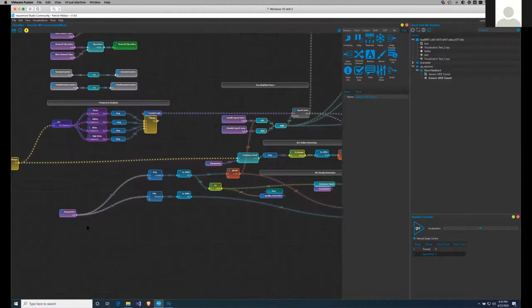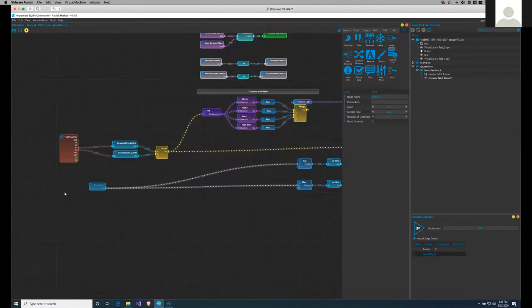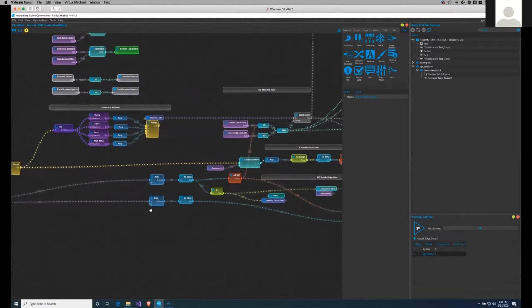We can also connect that particular node to an online switch. Some of the devices have the information: am I ready? Am I connected? Am I in the right state? For instance, some amplifiers can be in an impedance test mode or in a data collection mode. The Muse SDK outputs whether I am okay or not. So we just set it to 1 to make it more compatible, so it works with the test system and with all the amplifiers that do not explicitly provide that particular information.